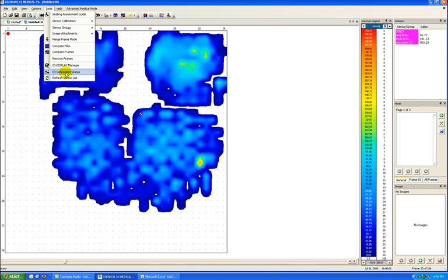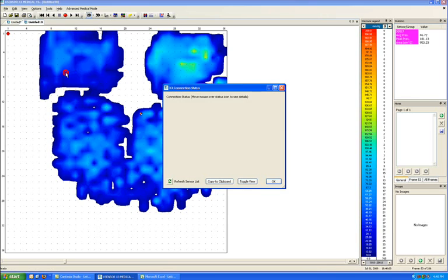If you wish to check the connection status of your system, you click on this option. It will show you the different components in your system, such as the sensor pack and the sensor that you're running. This is a great way of checking to see whether your system is operating properly in its entirety. And if you see anything other than a green check mark here, you know that part of your system is not connected properly or may be experiencing technical difficulties. Reconnect, close the software, and then attempt to load it up again.